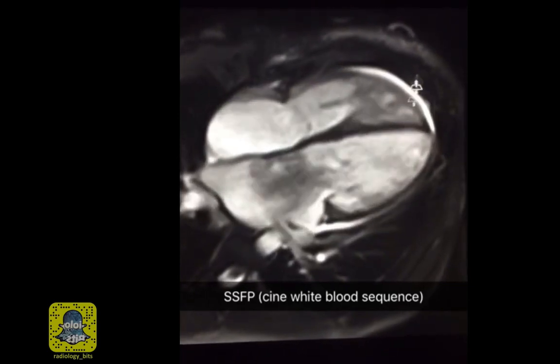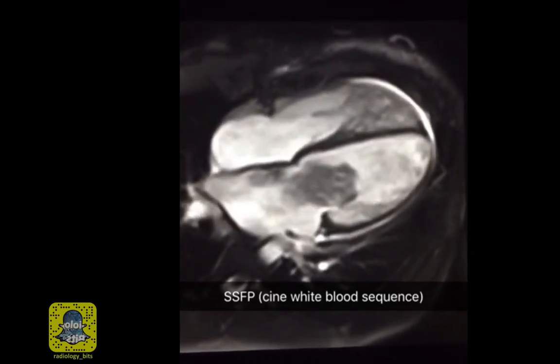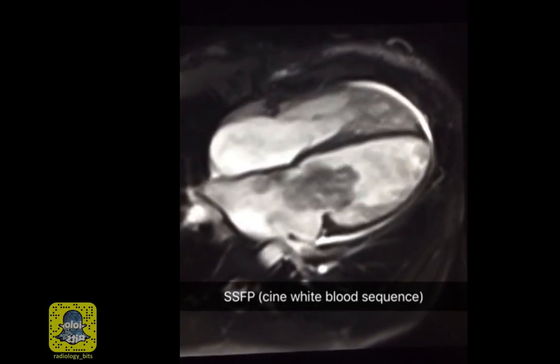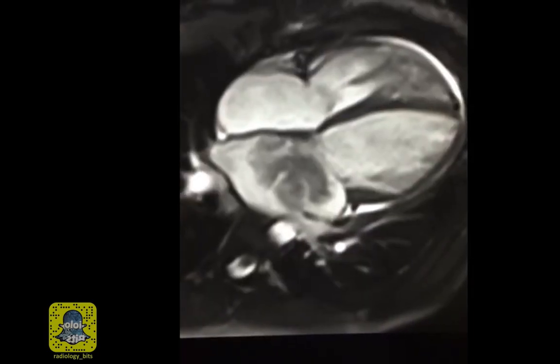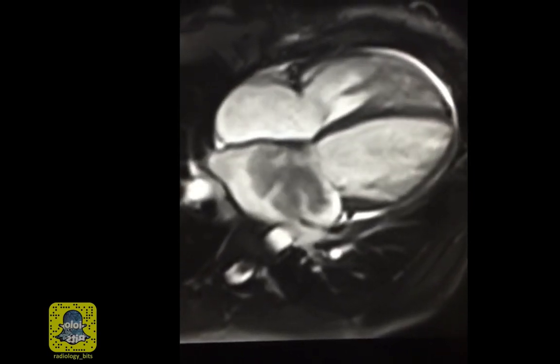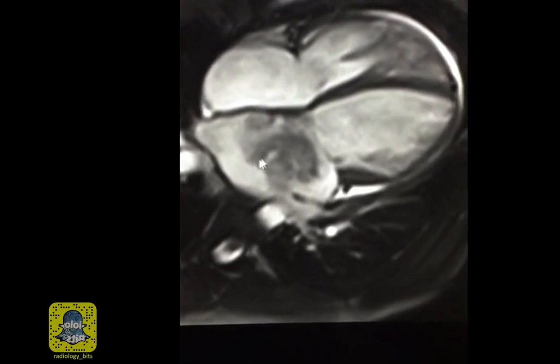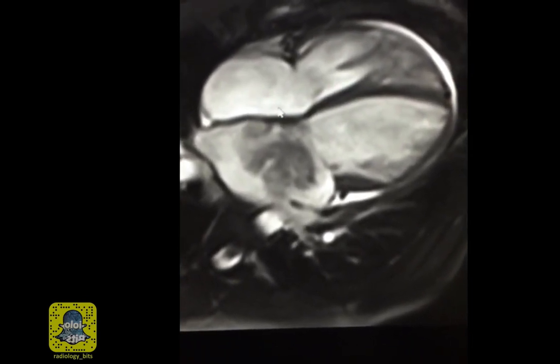Here's a different sequence in motion, which we call a white blood cine sequence, or scientifically speaking, SSFP. I will try to talk about these sequences hopefully in future clips, but let's just see what's happening here. There is this lesion in the left atrium. It has this cauliflower appearance or frond-like projections. It's attached to the septum.